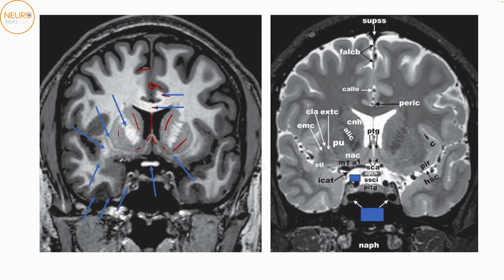Okay, now we're also able to see a structure running between the temporal and the frontal lobe. So this is your temporal stem. There's also a very big mass of grey matter over here. So this is the amygdala. Again, rhinal sulcus, the entorhinal cortex. And this T1 hyperintense region over here is the cavernous sinus. You can make out the cavernous ICA here, and this here is the supraclinoid ICA over here.